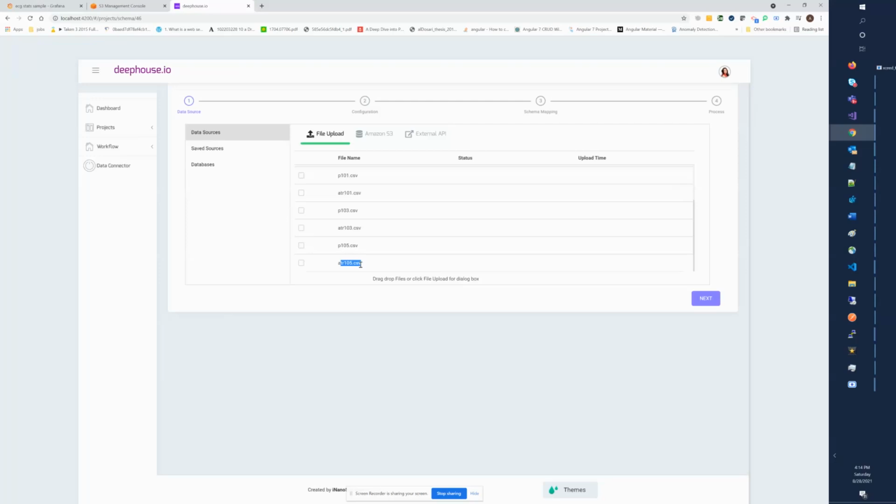This concludes our quick demo of the ECG monitoring use case for telehealth. There will be more use cases that we're going to be working on, and we will provide more video demonstrations as well soon.